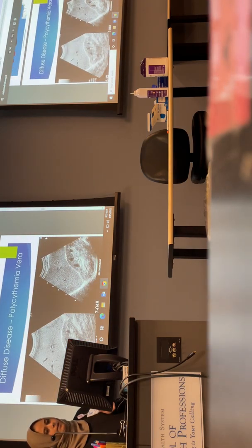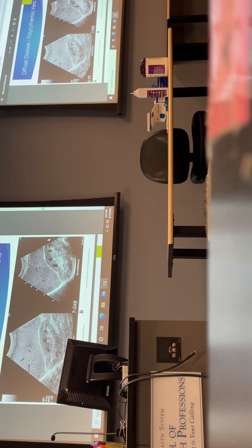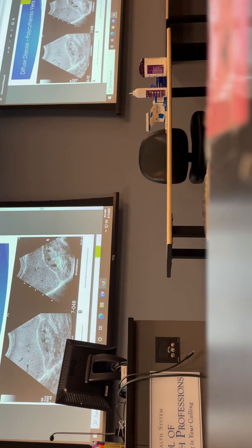Obviously, splenomegaly should be an easy one. I'm not going to give you these images and expect you to tell me polycythemia vera, because there is no definitive view of polycythemia vera. It just causes the spleen to get enlarged. That's what the majority of the abnormalities in this chapter do. So just be able to identify splenomegaly, okay?